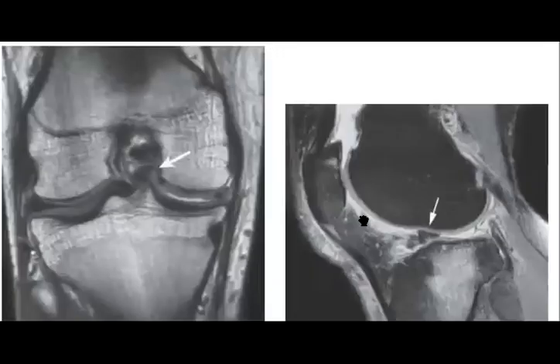And here again, sometimes in the lateral meniscus, they call it what? Flipped meniscus, yes. So again, a very similar mechanism, with displacement of the meniscal fragment in the intercondylar notch, and you can find this appearance.